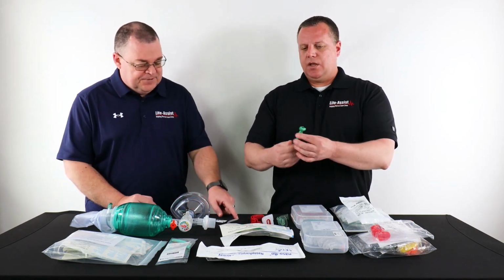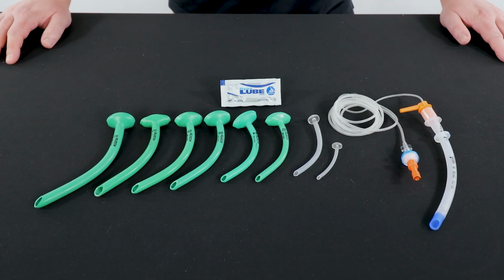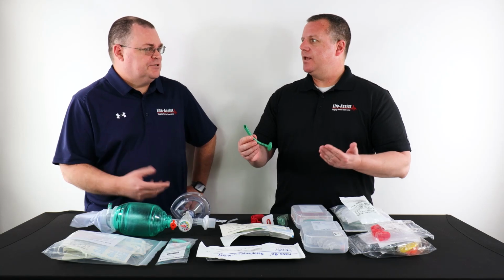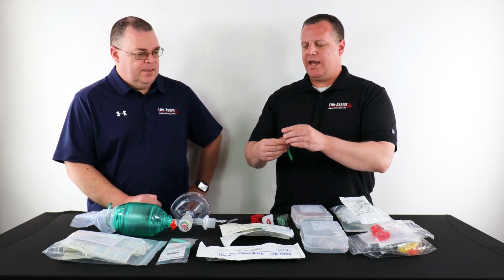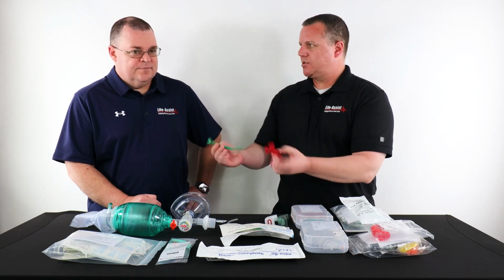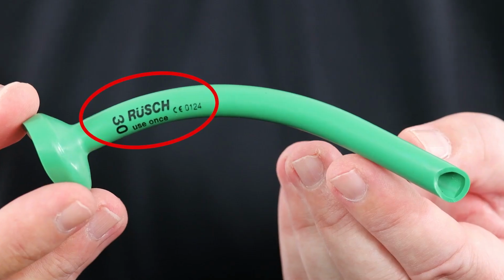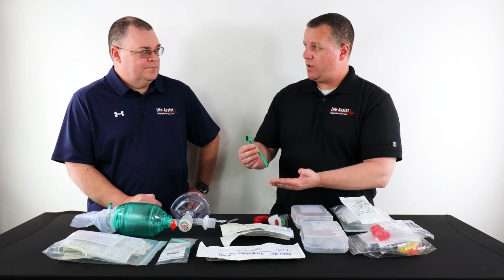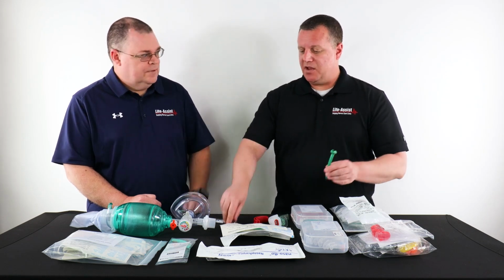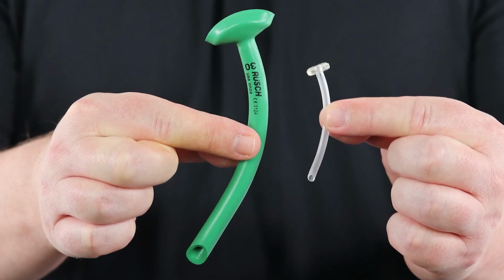Anything else you want to talk about with the nasal? Yeah, let's talk about the sizes for the NPAs too. These are measured in the French catheter scale, similar to a suction tube. Yeah, exactly. Usually on both OPAs and NPAs, the size will be listed somewhere on the device. The typical range for small ones is as small as 20 French, and then we can go all the way up to 36 French. I don't have these exact sizes, but you can see there's a substantial difference between those.